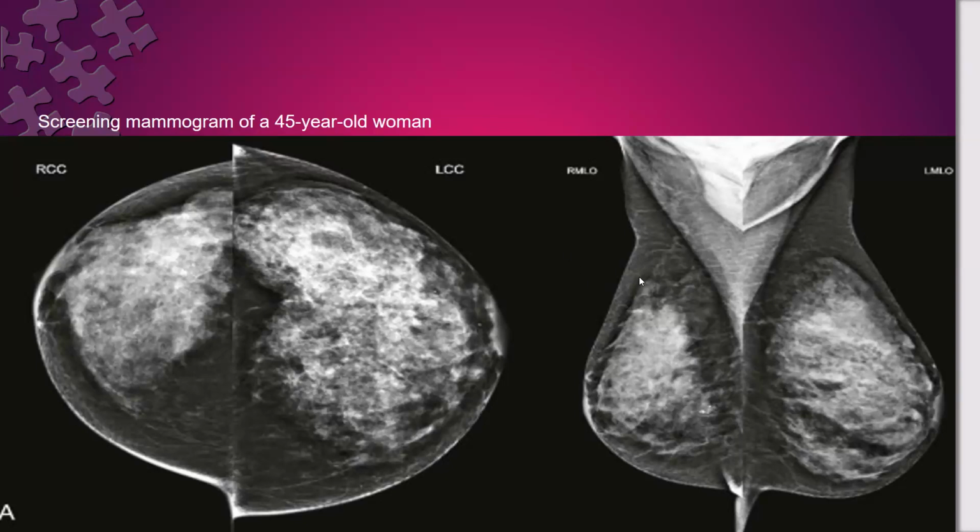But generally, no. If you look at the gland in relation to the fat, more or less the same. The whole breast is smaller on the right side, but the gland is relatively smaller, accepted, no problem. But generally speaking, the whole breast is smaller. What else?